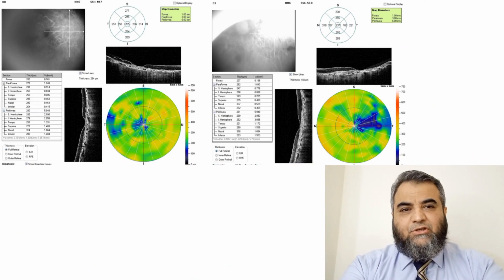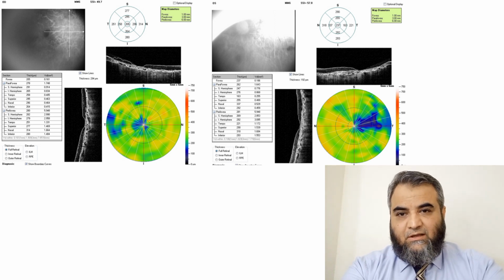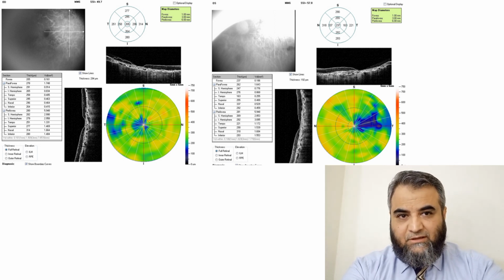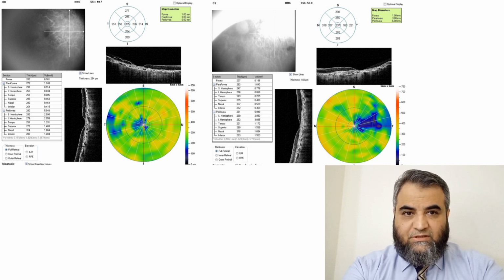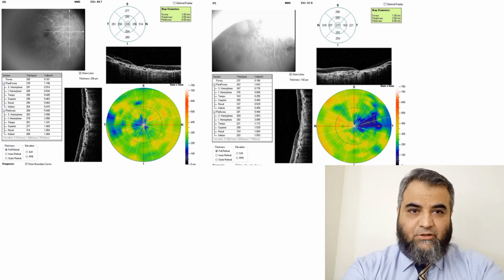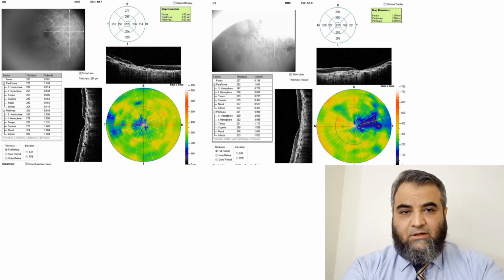These are slides of the patient almost 6 years back. If you see here, in the same patient both eyes were treated for the same disease, and the activity subsided. In the right and the left OCT macula, there was no fluid, no intraretinal and no subretinal fluid. So it was stable. The vision, as I mentioned, had already decreased because of cicatrization and scar formation, but it was stable at that point. So the patient was okay 5 years back.